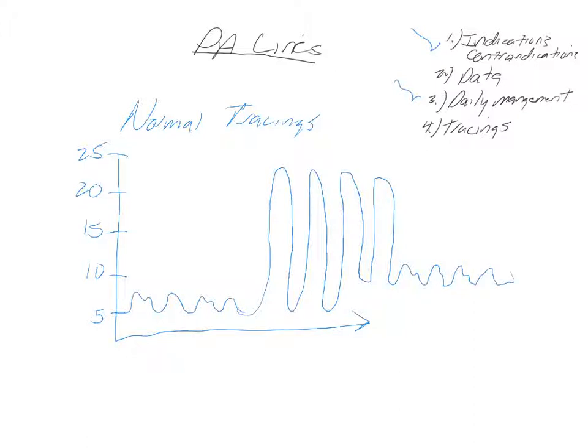And so we have RA, RV, PA, pulmonary capillary wedge pressure. And for the purposes of this discussion, it's always helpful to anchor yourself with the ECG. And on the ECG, the P wave represents atrial contraction, and the T wave represents, and that's a pretty poor ECG, but you get the idea.